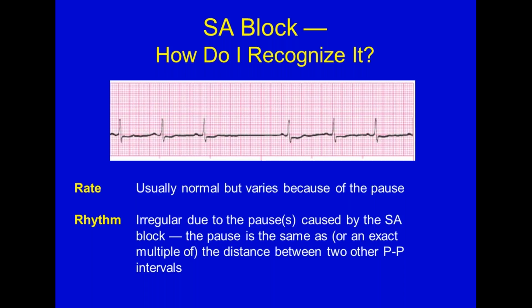So just right here, for whatever reason, our SA node either didn't fire or it fired and the impulse didn't get out. You may or may not see it, and I've never seen this that I'm aware of.